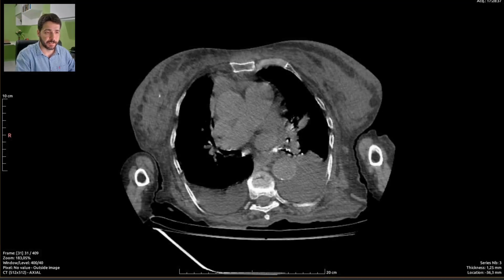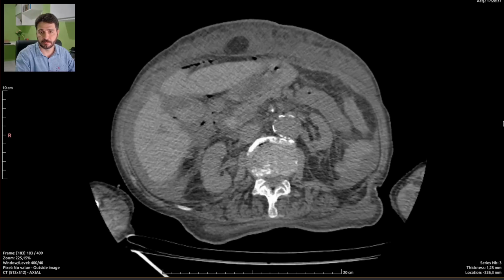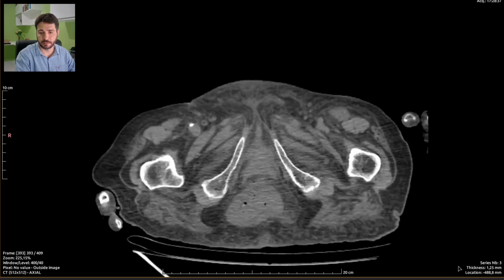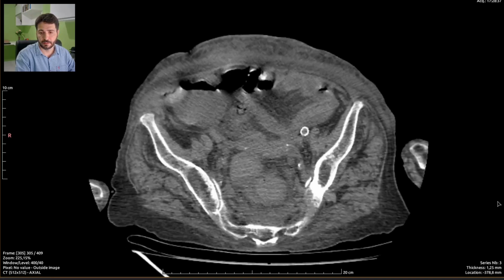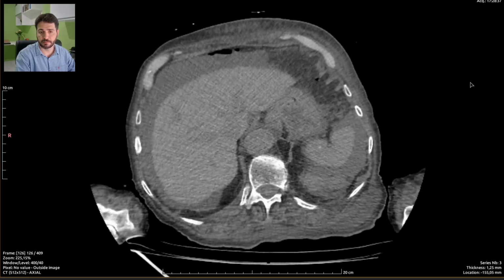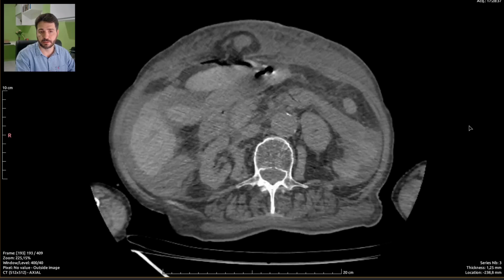And this is a terrible end stage case of some kind of horrible disease on this CT scan of the abdomen. Surely. And let's see what we can do, because we have no contrast enhancement. We have so many movement artifacts. Can't really tell much.